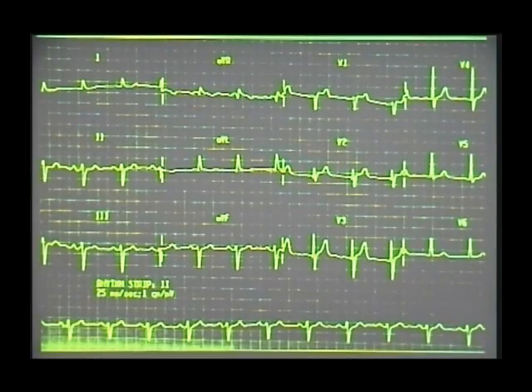So this is the first ECG. What is the axis here? The axis is left axis. So once you diagnose left axis, immediately look at the inferior leads. What's happening in the inferior leads? Initial small positivity with a terminal deep negativity. You see all three inferior leads look exactly similar.